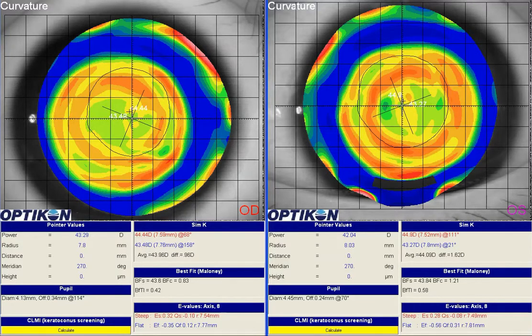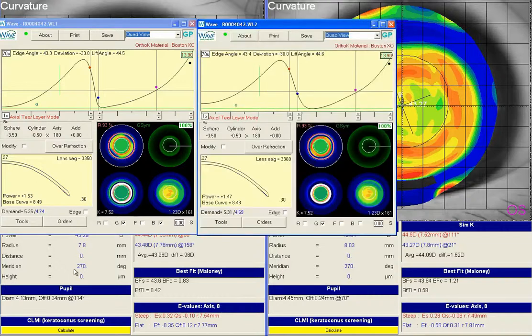So I'm going to bring up two lenses that the patient has worn in the past. First lens on the left and a redesign on the right. Looks like for the right eye, we brought the back edge of the OZ down so that we got a little bit more central clearance, and also turned the blending back on. I would leave the blending on, unchecked in other words.